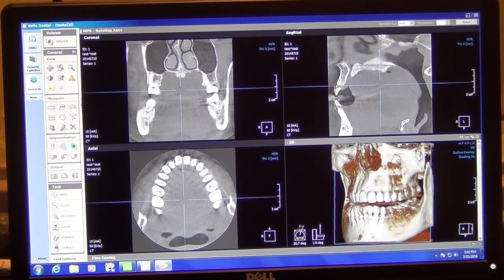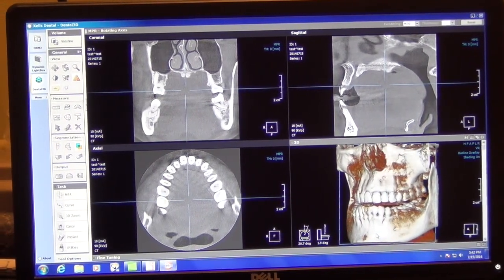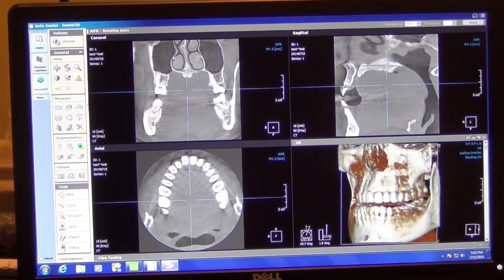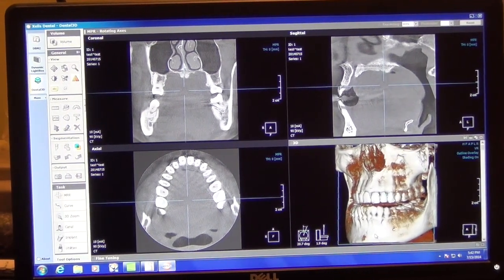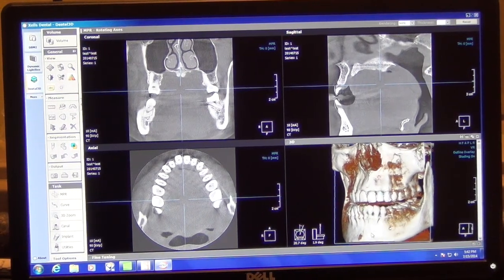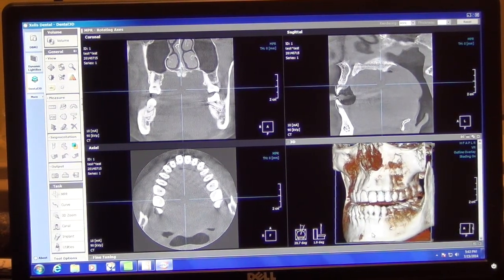Okay, do me a favor. Go through these tools slowly, on the left side. Just point and tell me what they are and sort of what they do, one by one. I know it might be a bit boring, but I'm sure they've got a purpose, and we might as well learn what they do.